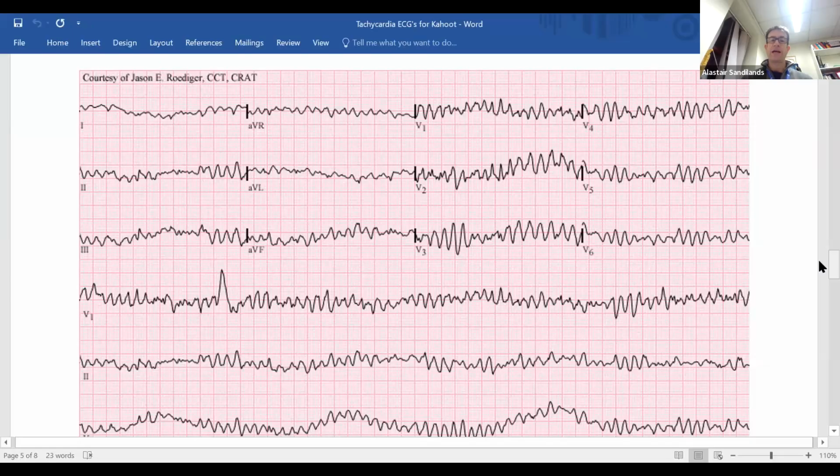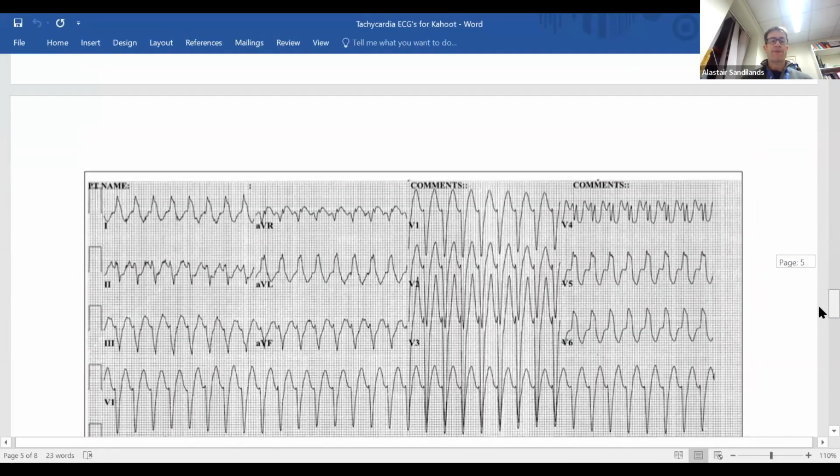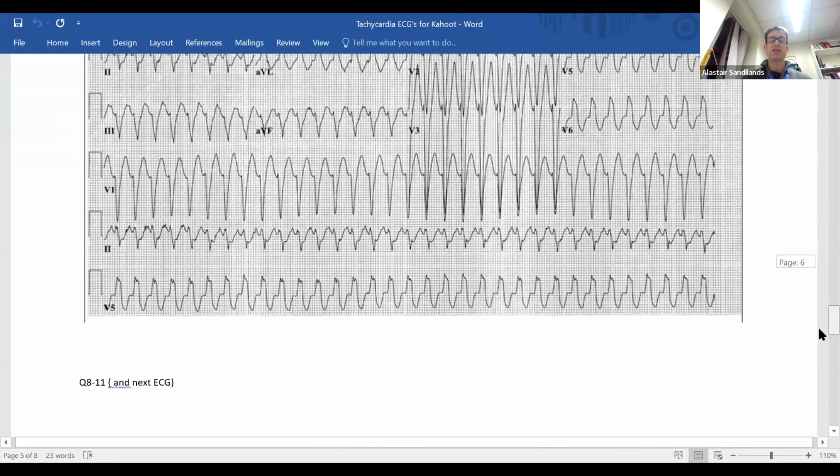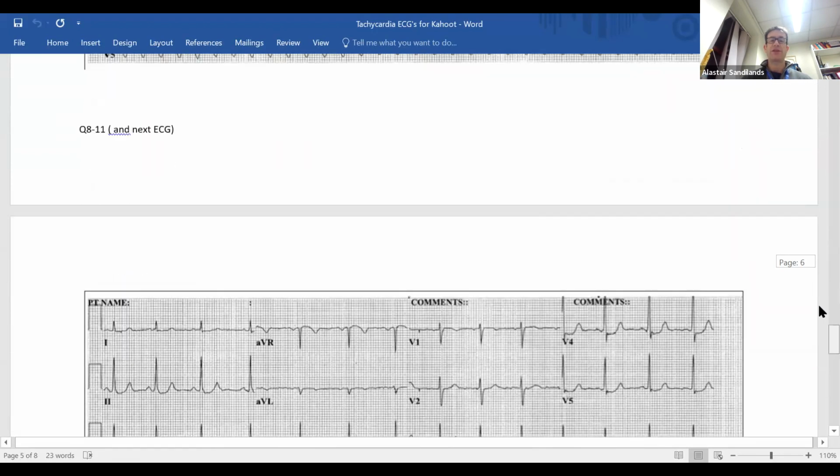Okay. So questions 8 to 11, and then the next ECG, 8 to 11. I'll let you look at that first.